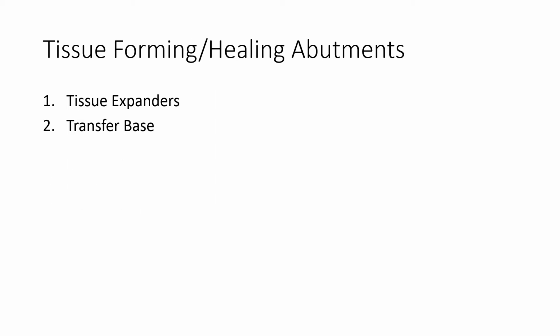When it comes to healing abutments, we provide two options in the system: tissue expanders and transfer bases. This presentation will look at the use of both of these types of healing abutment.